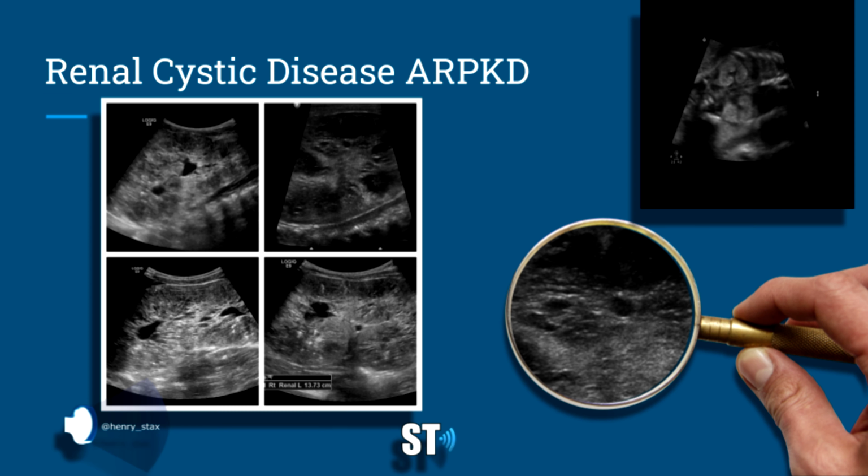All right, so autosomal recessive polycystic kidney disease. For autosomal recessive diseases, two copies of an abnormal gene must be present, one from each parent, in order for the disease or the trait to develop. In this disease, usually the symptoms begin in infancy, so it's called the infantile version. The kids usually have very large kidneys, hyperechoic kidneys.